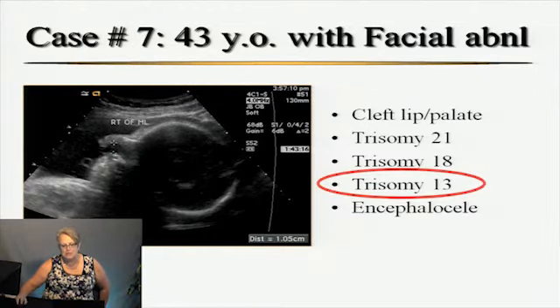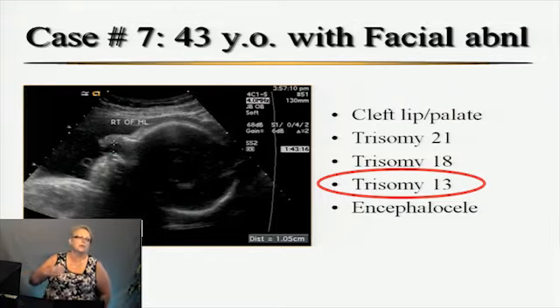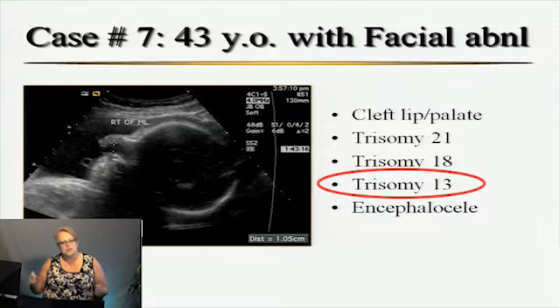It's trisomy 13. So again, looking from one thing, you see one thing, go to the next, to make sure you check those hands, the posturing of the hands, posturing of the feet. If you see one defect, look for more, especially when it's those midline defects.